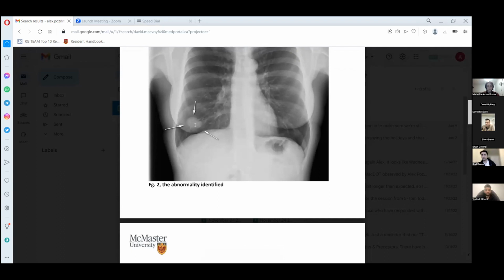Maybe it could be a cancer. A tumor? Anyone? Oh, sorry, a cancer. Yeah, very good. Yeah, mass for sure. Mass would probably be the most common thing that will give you a very well circumscribed mass. Any other ideas?